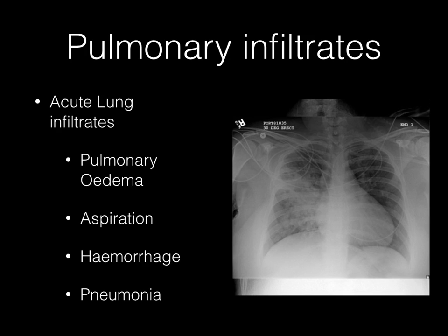In this case, it looks more like multiple infiltrates which have become a little bit more confluent in nature. Aspiration pneumonia, on most occasions, is because of a direct chemical insult, and the pulmonary response to aspiration depends on the type of the aspirate as well as the pH and the volume of aspirate.